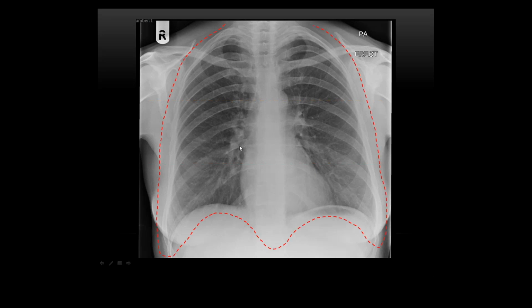So once I've done the lungs, as you can see, I'm working my way out, I now look at the soft tissues. Soft tissues are really important to look at on the chest x-ray. You can pick up some quite dense masses in the axilla. One of our radiologists has an area up here called the triangle of doom. Whenever you have any sort of malignancy in the chest, you can get lymph nodes in the supraclavicular region. You can get increased density in this region up here.